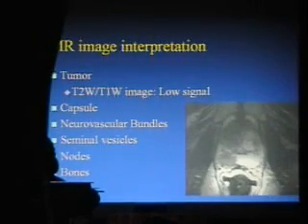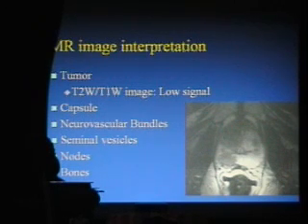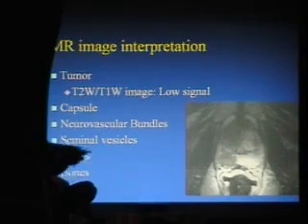I'm going to show you a clinical case in a few minutes, but let's just go back to what T2 does for us. T2 weighted images will show us the focal lesion. It looks like this. Cancer in the prostate, unlike most everywhere else in the body, has low signal intensity. Most everywhere else in the body, like that melanoma or the cervical cancer that I showed you, are high T2 signal because they've broken down their extracellular membranes and they've got lots of water in them, so they tend to be high T2 signal. But this is atypical. It's going to be low signal intensity, most commonly a discrete mass.